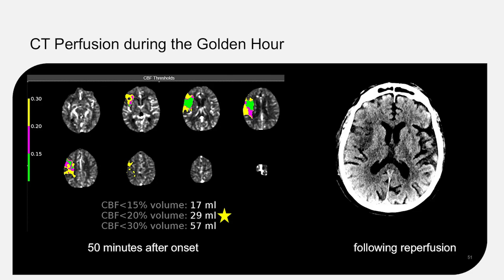period of time. If you have really low CBF for 5 minutes and then you reperfuse the vessel, you have a TIA, no irreversible injury. So we're taking the concept of time in here. So if you're fortunate enough to scan somebody within the first 90 minutes, then you have this 20% threshold, which is presented on all of the rapid images, and we will use that.